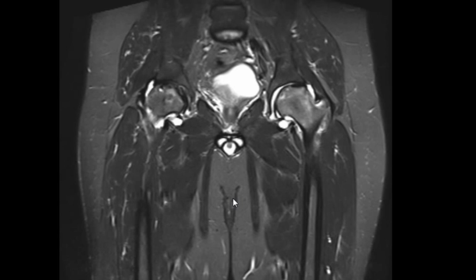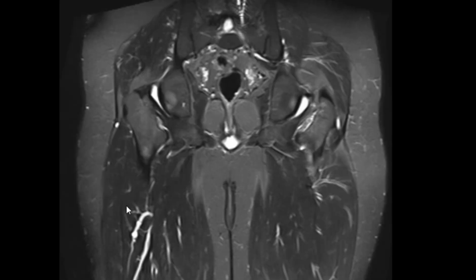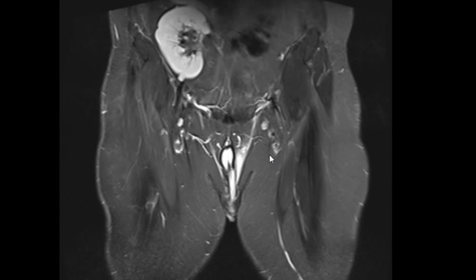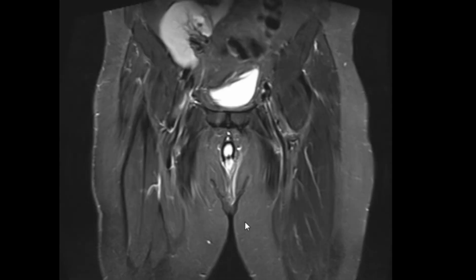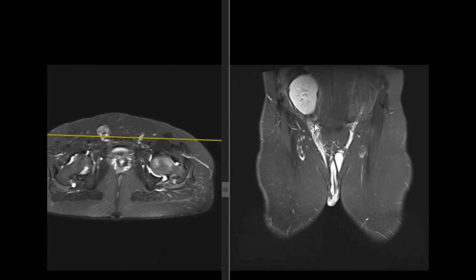Any other finding? Okay, let's take it from another perspective. Can you put these together? Why does this 25-year-old healthy man, who is muscular and in good shape, have this? Is there drug taking? Can you put them together? What's wrong with him? So, transplanted kidney. Transplant kidney, immunosuppressants, steroids led to bilateral avascular necrosis.